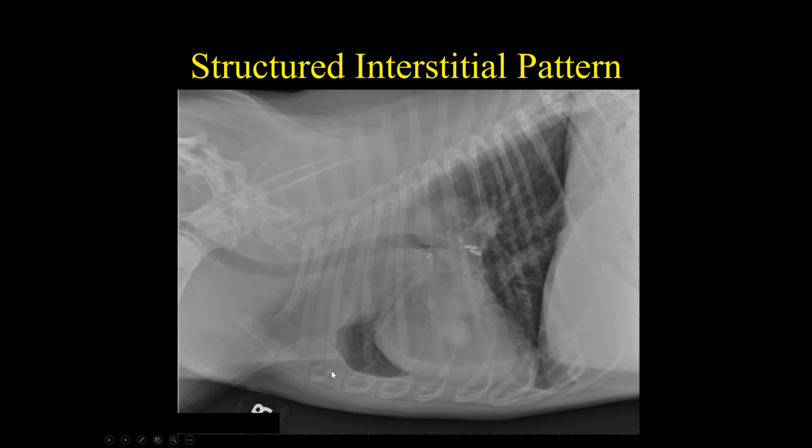So this dog has several things. He's got lymphadenopathy and large lymph nodes in those three places in the thorax, but he's also got nodules in his lung. So there's a really good chance this dog has something besides, it could be neoplasia, but it also could be granulomatous disease or fungal disease. This dog here had fungal disease. He had what's called coccidiomycosis, and you probably learned about that. And this is really common in the arid desert areas of the world. So in the US, you'd think Arizona, Nevada, parts of California. Coccidiomycosis, otherwise known as valley fever, pretty much every dog has it.